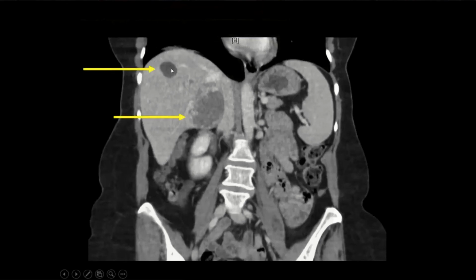And you notice that the boundary here is really well formed. It's a nice round circle. And then this is your solid lesion. It doesn't have quite as nice of a boundary, so it's not clear exactly what it could be.